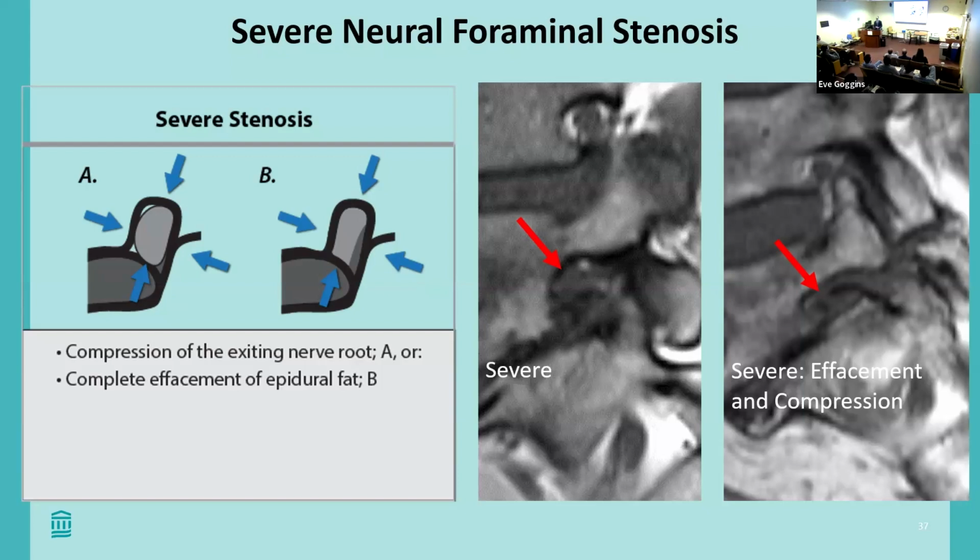And then I was talking with the surgeons, like, yeah, hard for me too. Like, okay, glad it's not just me. The foramina on C-spine are very difficult because you have your T2s and your gradients typically, and they're each kind of showing different things. And then you have CT as well, where CT is excellent for the neuroforamina of the C-spine. In the C-spine, you're looking at the axials or like kind of sagittal obliques, where in the lumbar spine, you're looking just in the straight sagittal.